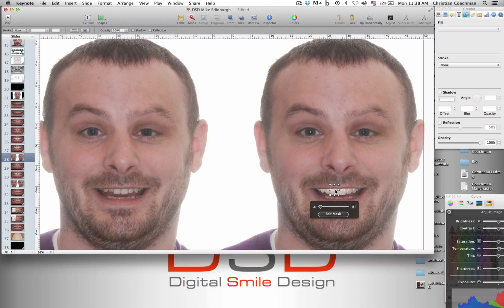Now, of course, I can move the teeth as I want here. Look, it goes behind the lip. And so, why does the lip look so good though? It's the same picture. I know. It's exactly the same picture you have duplicated. So this is almost like there's two pictures of this, but you're only seeing this bit of the picture. So I have the pieces here. Okay. They're perfectly overlapped.